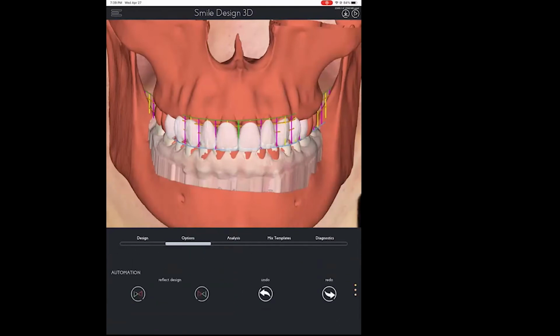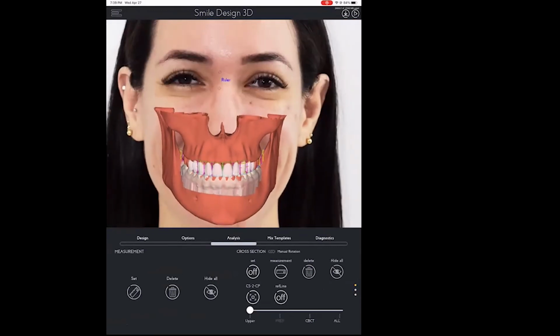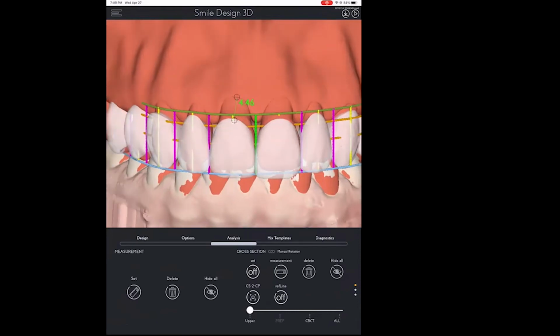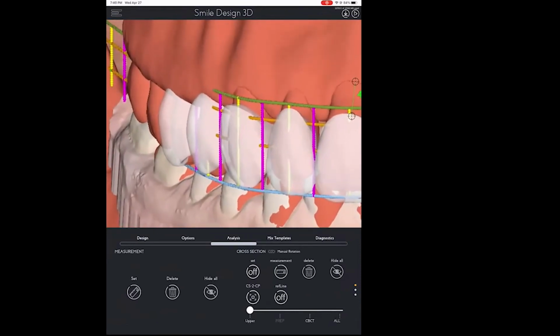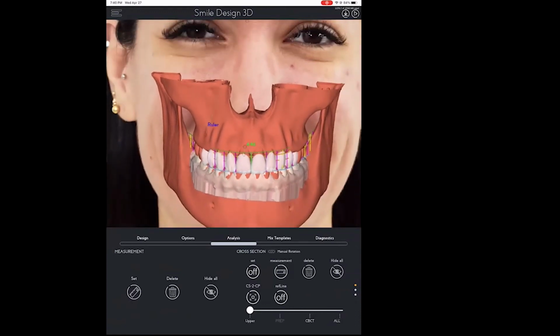Here, for example, let's see. So this is absolutely possible. We have 4.46 millimeters between the bone crest and the new cervical margin of the future restorations that I'm proposing. When it comes to the premolars, it gets a little more complex. That's why we have to do an open flap.